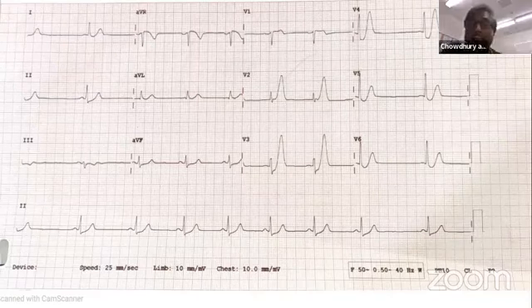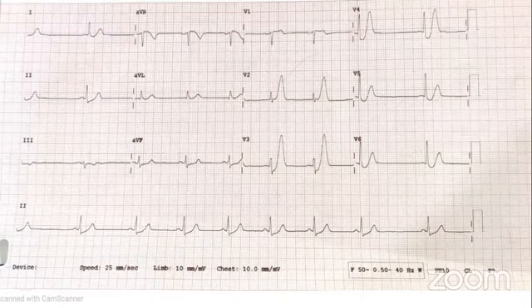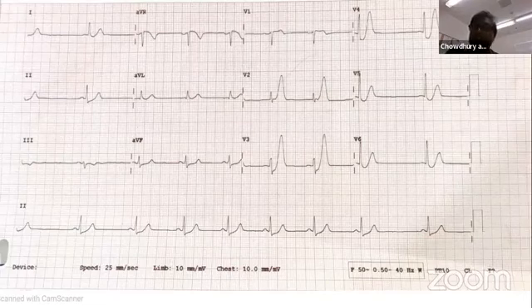Excellent. Can you give me that EKG? Just before this lecture, we had a lecture earlier where this was discussed, and this is so practical that we get this ECG just before the presentation. So let me be your student.